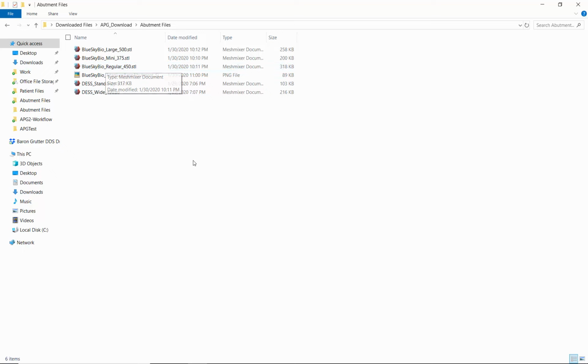Beyond that, we really don't care because there are many different implant platforms, but they all, from Blue Sky Bio, fall into one of these 3 categories, from the margin of the abutment to the tie base, to the chimney itself. Those are the only things that matter for this approach.